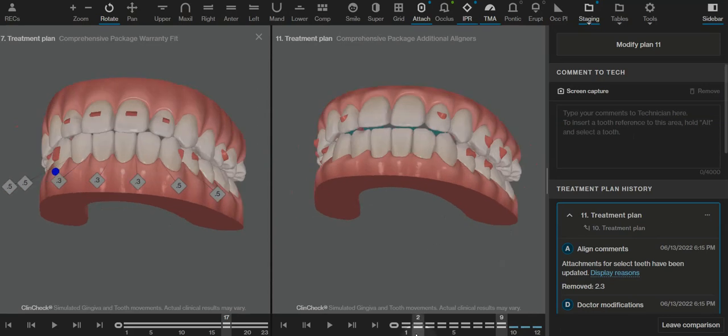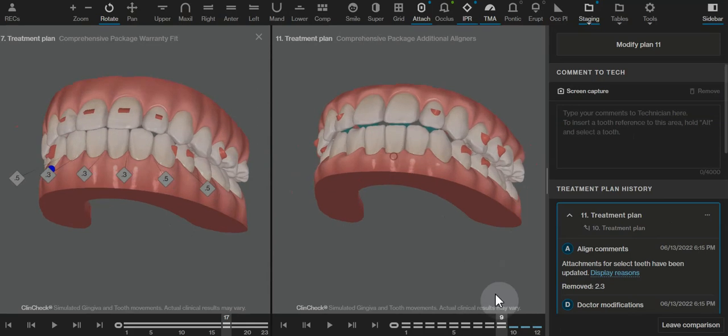Looking at the lower, the goal really is to get those lower anterior teeth away from the upper and relieve that interference. Since this started off with spaces on the ClinCheck, we're intending to close all those spaces, but it's possible that there could still be a light contact or 2, and that's what the anterior virtual C-chain is for. You'd only want to use one of these aligners at a time. You do not want to give out all 3.